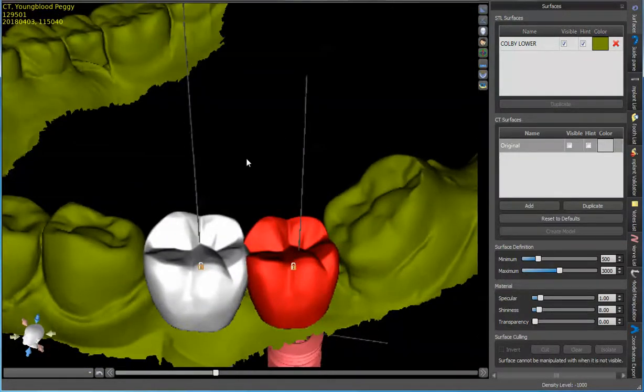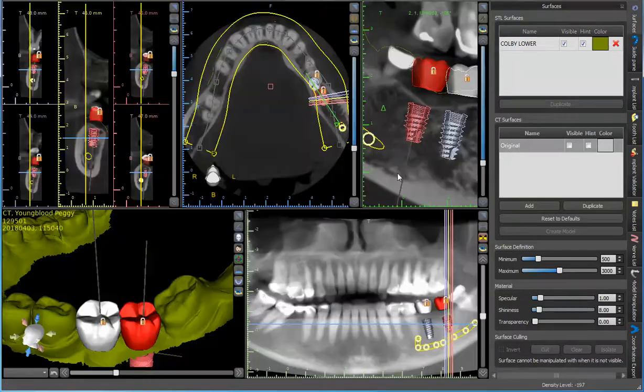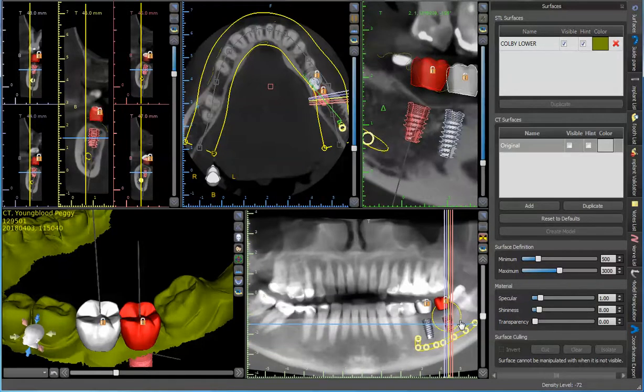Could you angle this a little bit more this way? Absolutely. It's not that difficult. Click on this, just rotate it. Now watch this area right here. So that's a little bit better.